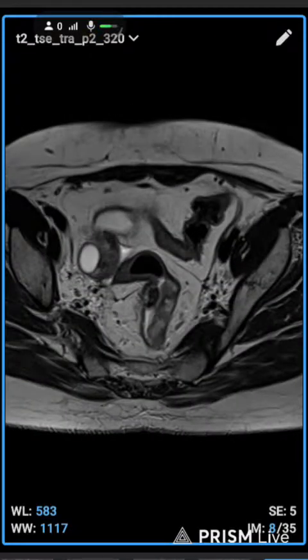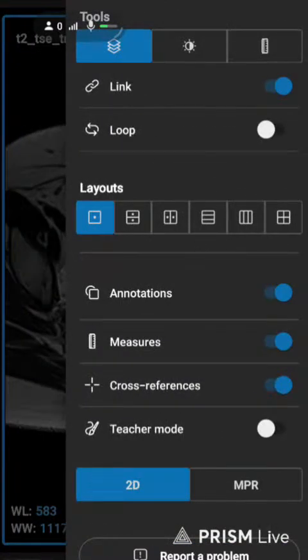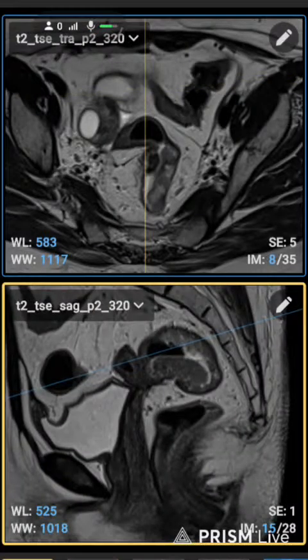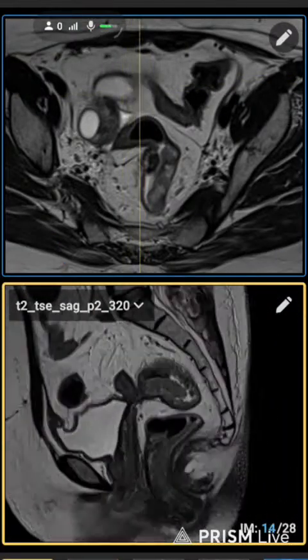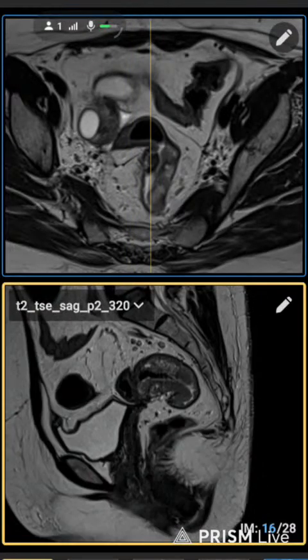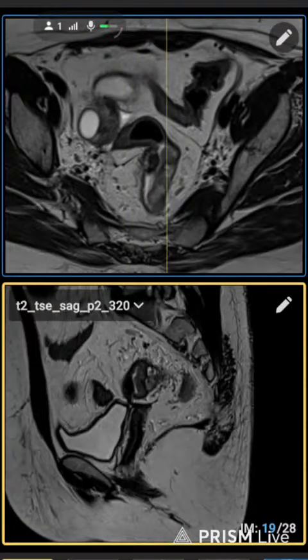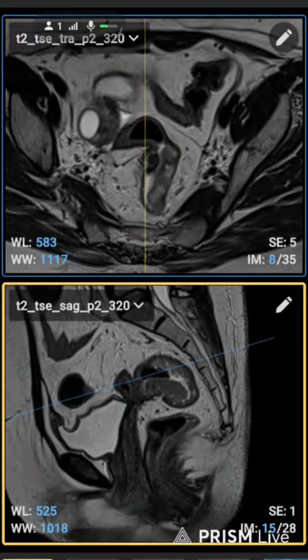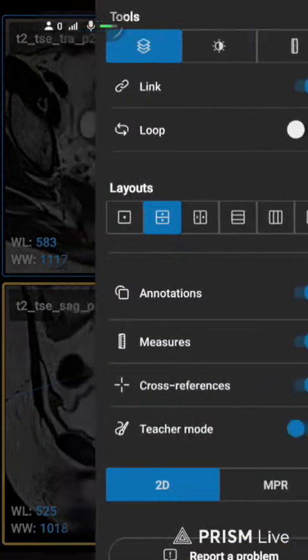And in the rectum, this protocol is called the rectum protocol. If there is a lesion in the rectosigmoid area growth, its protocol is called rectum, just because lots of patients have lesions in the rectum.